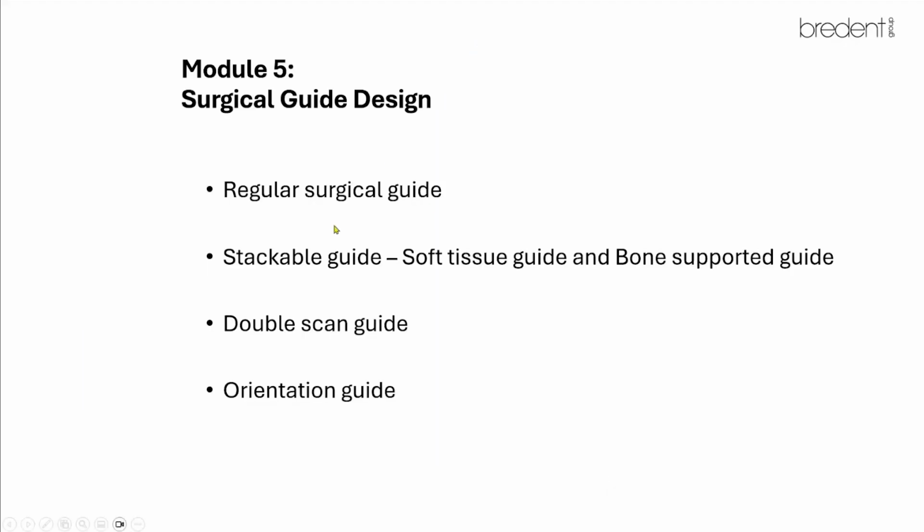Today we'll be learning together regular surgical guide designs, stackable guide both on soft tissue and bone supported guide, and also double scan guide. How do we manage to make a guide out of the denture, and also orientation guide.